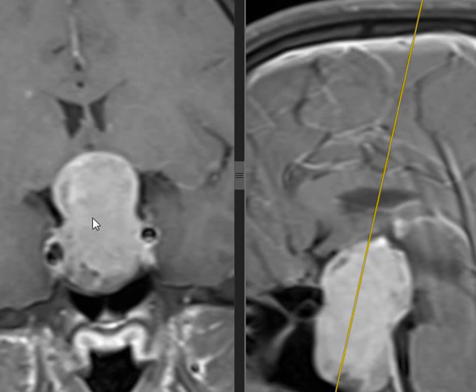To say it's encased, we need to see the lesion on both sides of the nerve. Here we see the lesion only on one side. So basically it's compressed. Whether it's invaded or not, we cannot say with very high certainty. The important thing here is to mention that the right ICA is encased because it will change all the management.